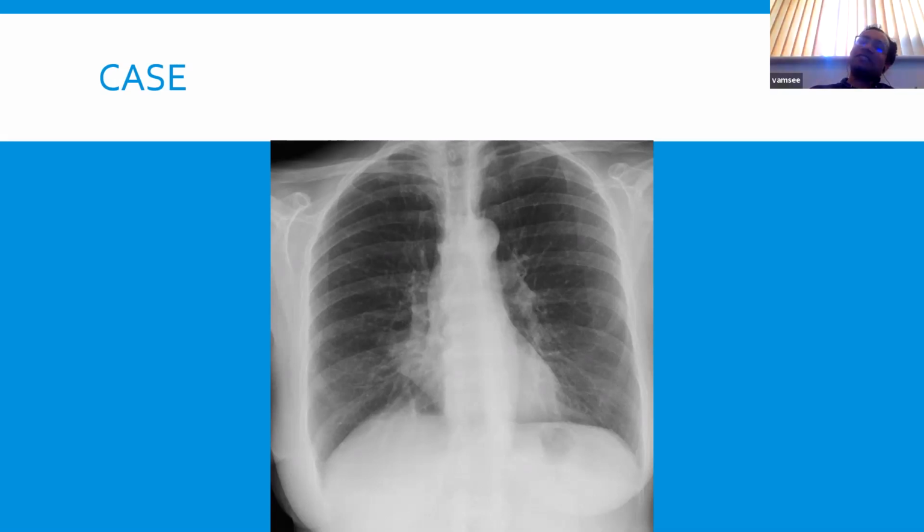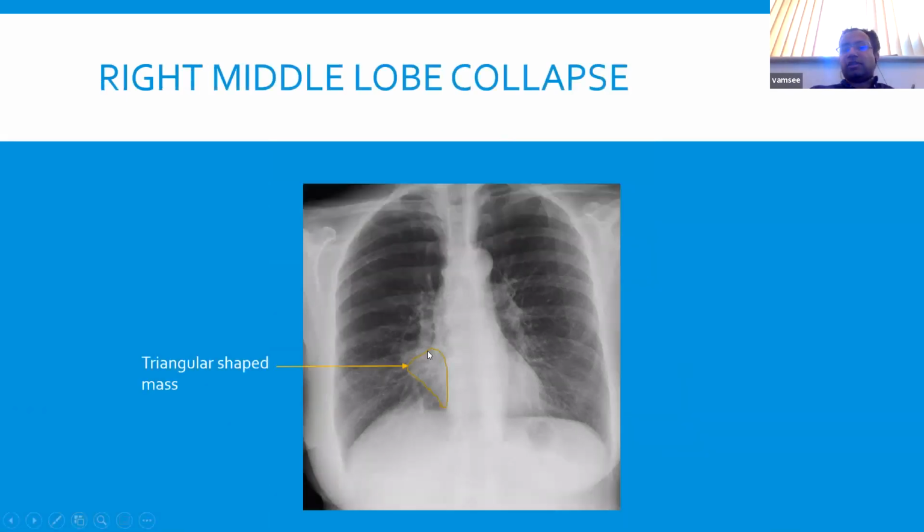Interesting thought, I haven't really thought of that. Actually, what I wanted to highlight is that some of these changes can be subtle. So go to the next slide. If you go back to your normal contour, the border actually isn't as crisp as you'd expect, because normally the right atrium is meant to be a straight line going down. You shouldn't be seeing it bulge like this. Yes, you have your normal vasculature going through, but that shouldn't obscure the crispness of the right heart border.